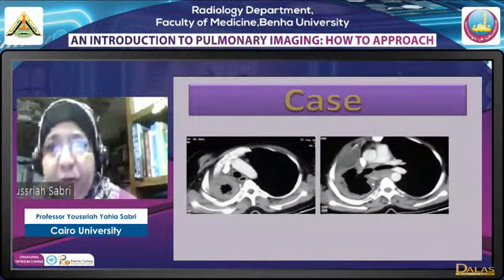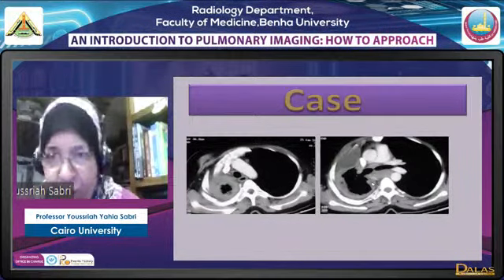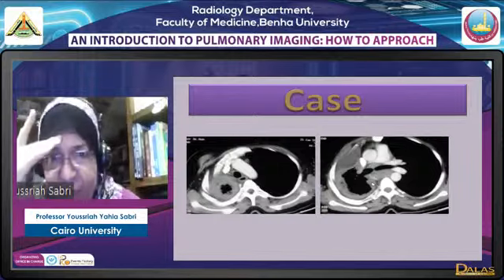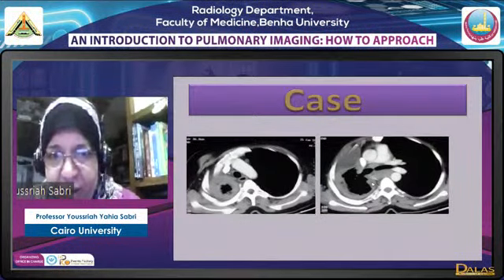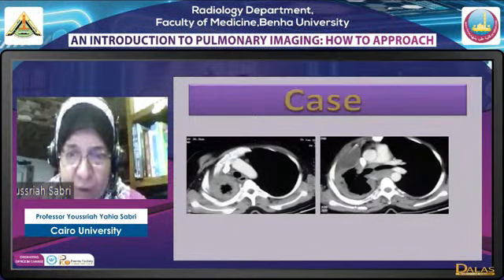By the way, a mesothelioma may be associated with decreased volume, and this is a classic pattern, or a normal volume, or even an increased volume if it is sometimes associated with a mass effect and effusion. So the volume change has nothing to do with it. If it is decreased volume, it is more pathognomonic. Circumferential nodular thickening associated with effusion.